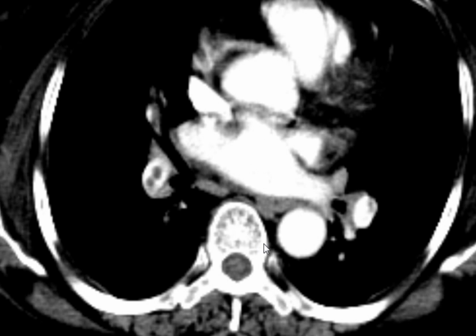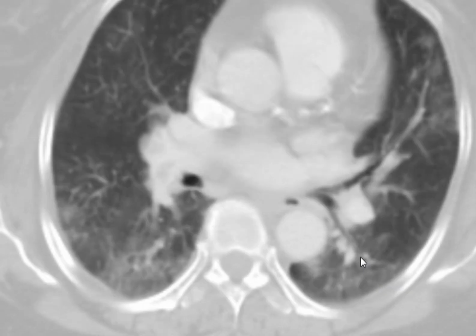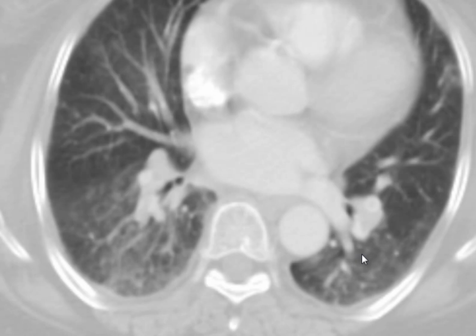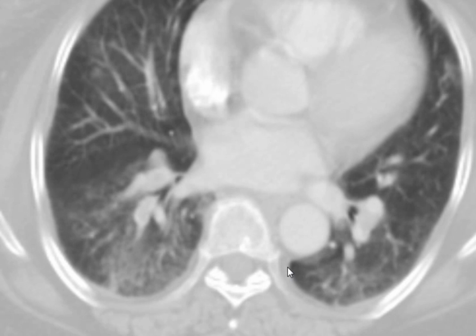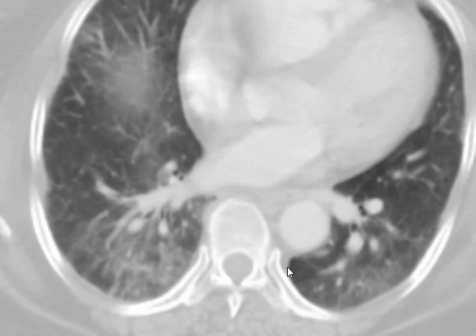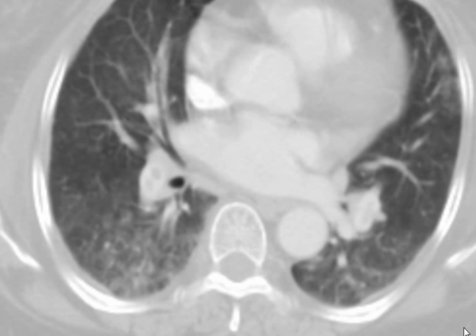So the patient, if she takes general anesthesia and the anesthesiologist has no idea that she has pulmonary emboli, it might prove fatal. You can see there is some congestion in the lungs, probably related to the pulmonary emboli. It's on the border of having multifocal pulmonary infarctions. Okay, high second.